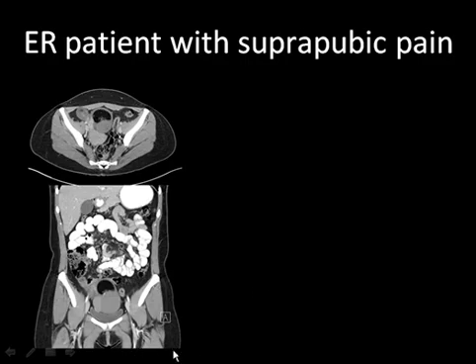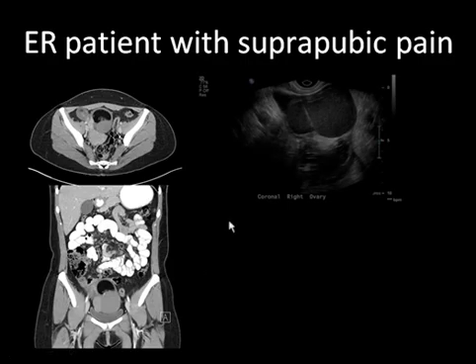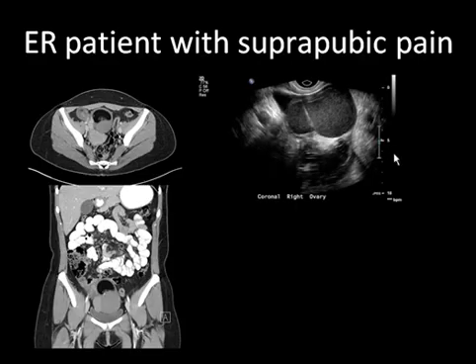But because the patient was presenting with pain, a transvaginal study was performed to exclude torsion. Images of the right ovary demonstrate the classic appearance of a dermoid cyst. We have a component made out of the sebaceous material, composed of low-level echoes. We also have an echogenic nodule and some linear echoes relating to the hair within the dermoid cyst.